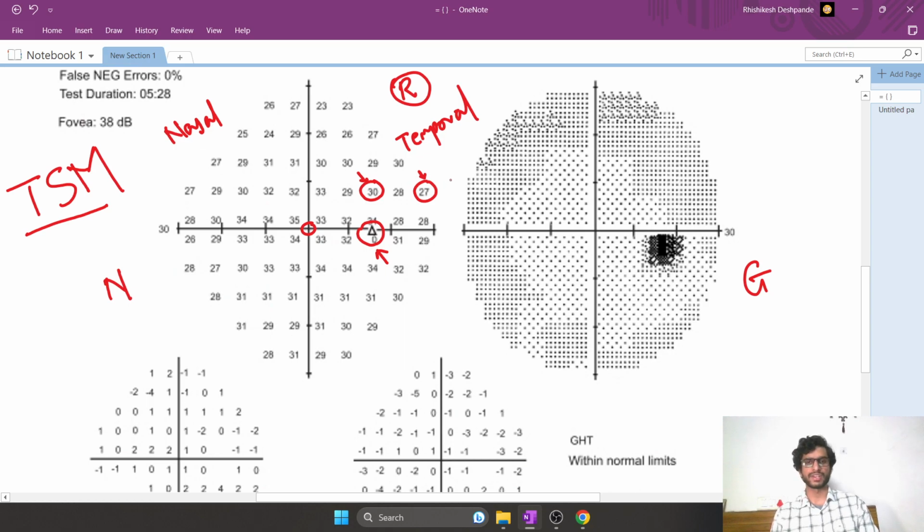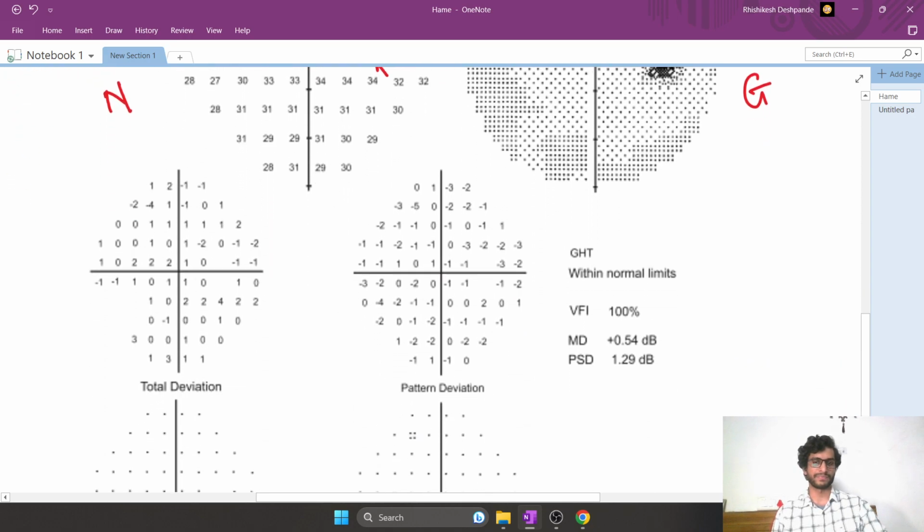A little bit of variation in the periphery is normal, because the sensitivity is maximum at the fovea and decreases as you go away from the fovea into the periphery. So this is largely normal, and you could prove physiologically that the central area has a higher sensitivity than the periphery. This appears darker, so this area will be less sensitive and less likely to respond to the light stimuli than the central part, which is what the physiology says.